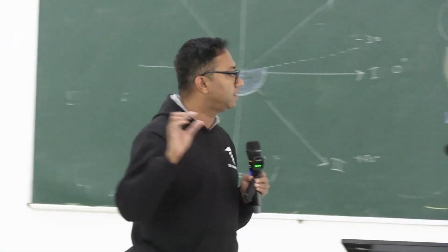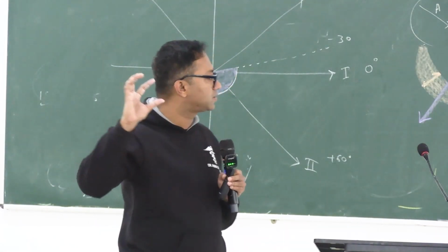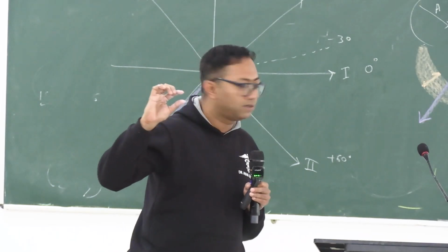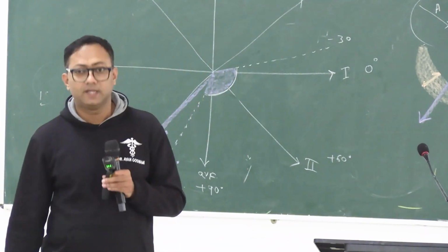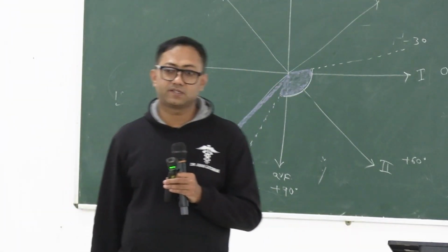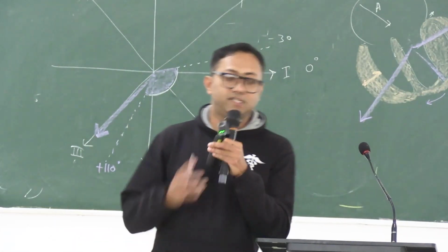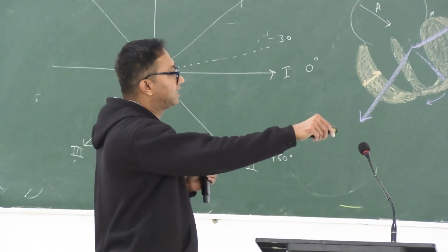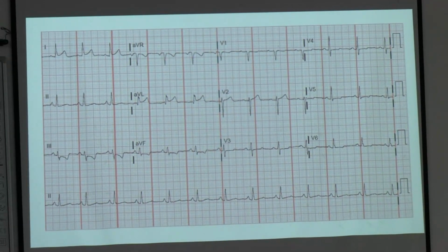So for the P wave, usually we do not measure the duration, but often we measure the height of the P wave. It usually does not cross more than 2 small squares in an ECG. You know, 2 small squares in the vertical axis means how many millivolts? In the ECG, this is a graph, right? The x-axis is time and the y-axis is voltage.